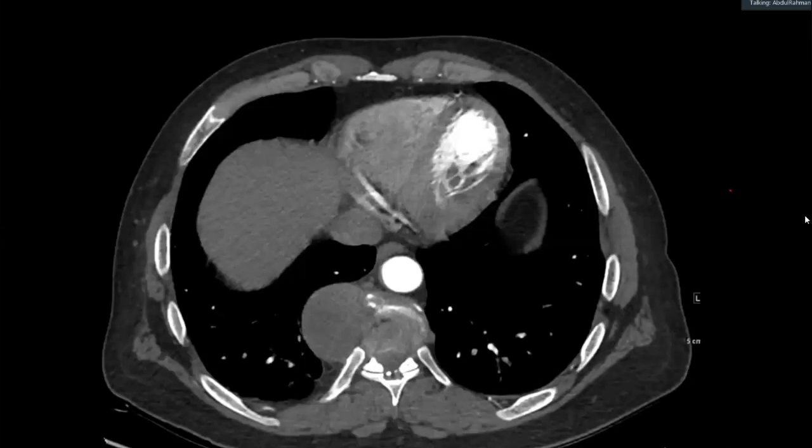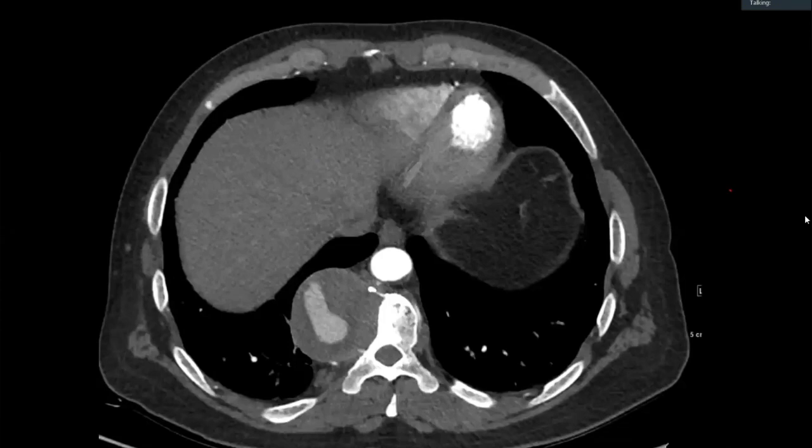Excellent. So this is the lesion. This is the arterial phase CT. What is it? This is a soft tissue density lesion, and its center is well opacified. It is taking contrast, so it can be an aneurysm. I will look through the other images for continuity with the main vessel, but the way it is opacifying, it looks more like an aneurysm.